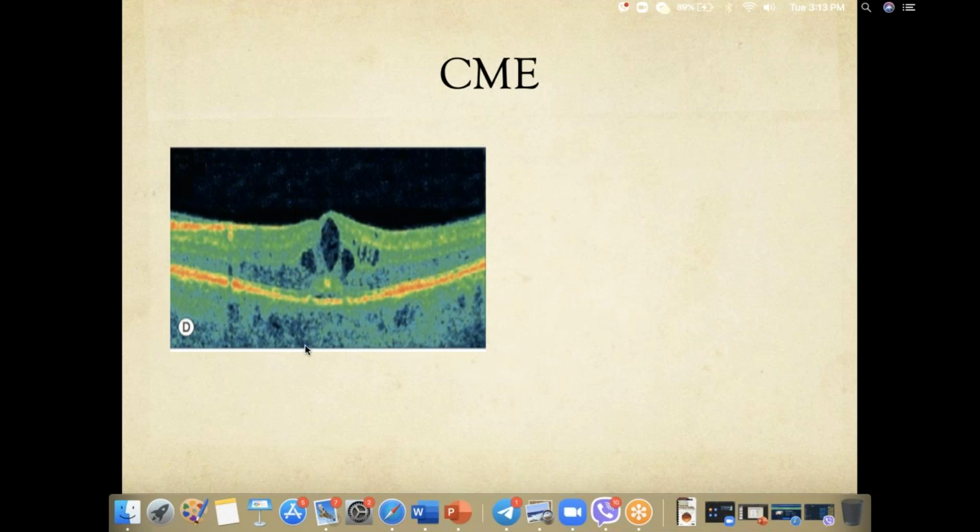Now, depending upon how the rest of the layers of the retina are, because so much we are focused on the layers and only on the macular area, we forget to look at the areas around the macular area. This is a cystoid layer here, three large cystoid spaces. Over here, it looks fairly normal. So in this, I will inject, and as suggested, average visual gain, poor central vision.